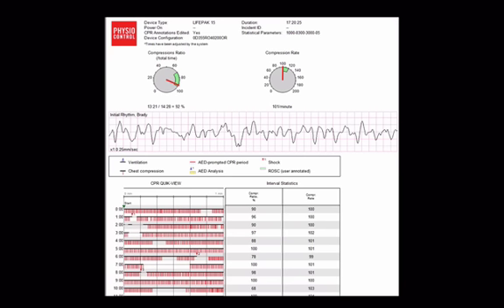When you receive one of these code reports, the information contained within it is generated from the start to the end of the period that you are actually working the code that the LifePak was on. I'll show you in a couple of minutes just where the data comes from and what it looks like in raw form. And this is kind of a summary sheet. Up at the top, you'll often see when the machine was powered on, the date and time, as well as some other general information from the device. There is no patient identifying information such as name or date of birth, so this is HIPAA safe information.